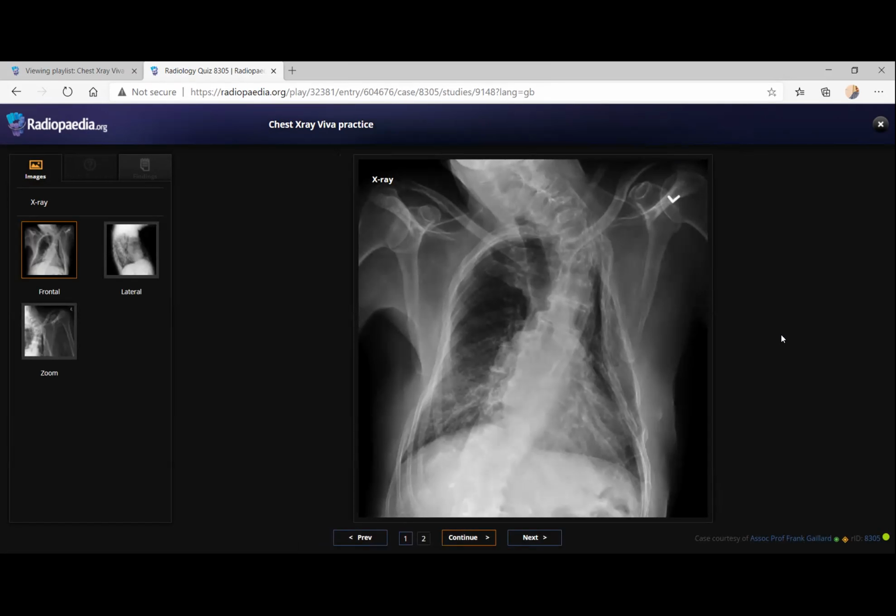It's just as the examiner told you, he had a surgery very long back. It's another surgery for tuberculosis, that is a thoracoplasty done for tuberculosis. They will remove the lung and remove the rib and all. So just know whether you know that surgery. That's all.